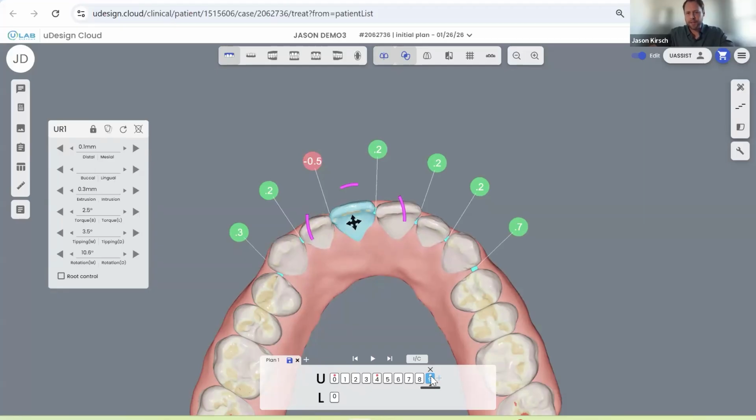At stage 9, if I start to move the teeth, it's really just going to affect this last section of movements that I've done. So I hope that answers your question in a quick way. If you have certain scenarios or certain examples, then this is the way to do it, and we can definitely set up a call to look into it further.